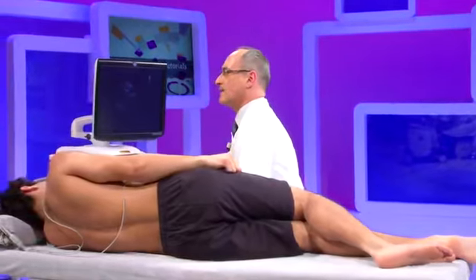So the point is that every measure, every image that you can acquire during the present study should be compared with the previous one to be able to say, okay, this heart transplant patient is going well or is going to have a suspicion of a complication such as acute rejection or CAV.